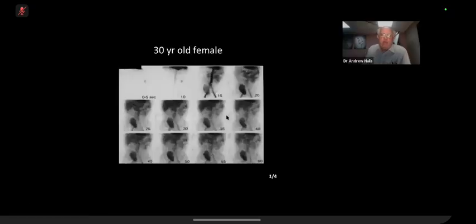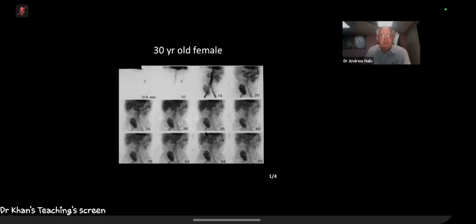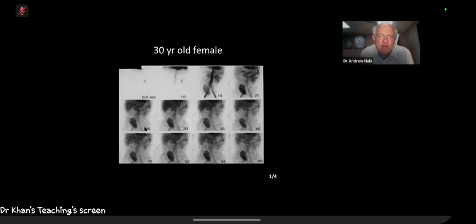Okay, so what's this? A transplant kidney? Transplant kidney, okay. So it's a transplant kidney on the right side or on the left side? So it will be on the left side. No, I'm confused. I produced the answer myself.